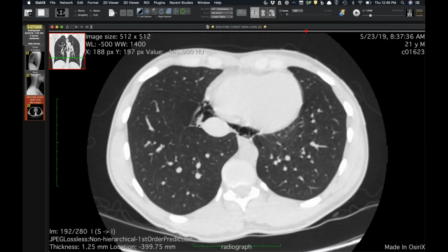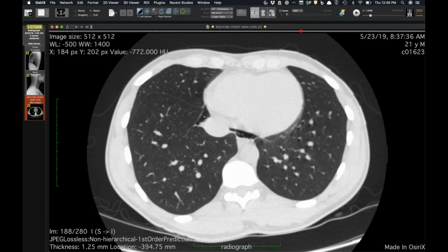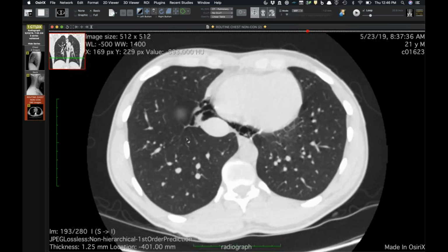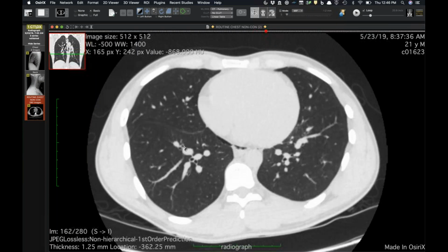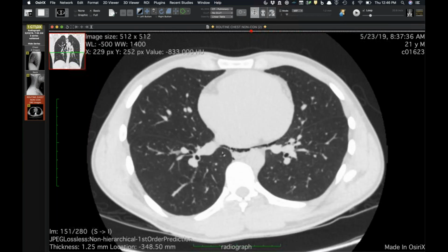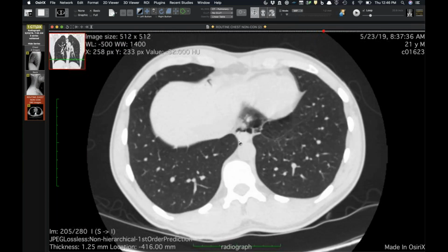And I guess a little of this you would say is along the inferior pulmonary ligament right in here. No, that's actually the phrenic nerve. Is that the phrenic nerve right here? Okay. Right. So this is the phrenic nerve reflection, and then the inferior pulmonary ligament would be, oh, is it? It's more posterior, like in here. Right. Okay. Yeah, those are still landmarks that I find confusing down here.